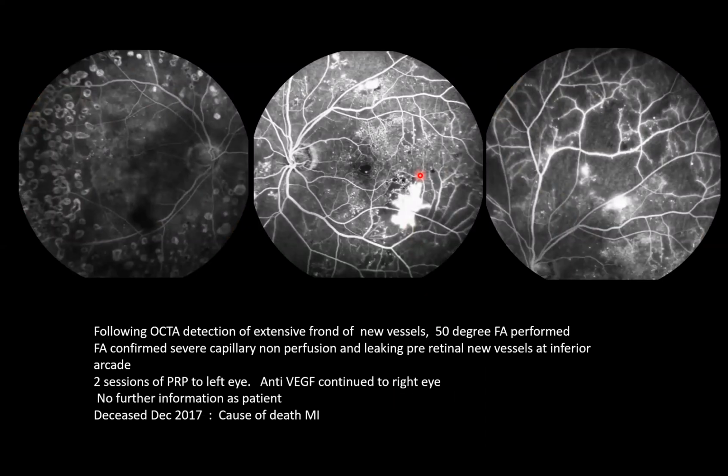So we did do the PRP, and you can see on the fluorescein that we were completely right. The whole neovascularization is surrounded by ischemic area, just as you would see on the OCTA, large areas of ischemia in the periphery. And in these ischemic areas, you can always see that the vessels, when they go through, seem to stain, or have a minimal leakage. It doesn't necessarily mean that this whole area is new vessels, but the leakage comes from the sheer fact that they're going through the ischemic area.